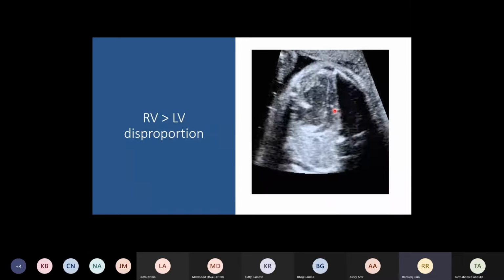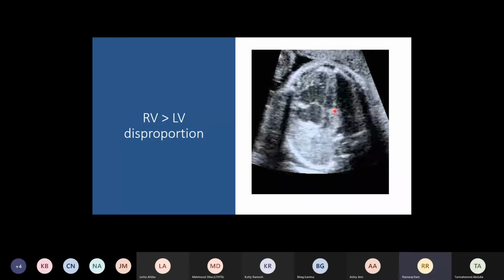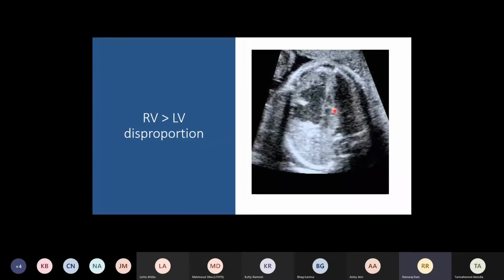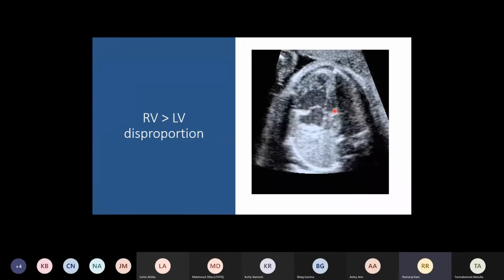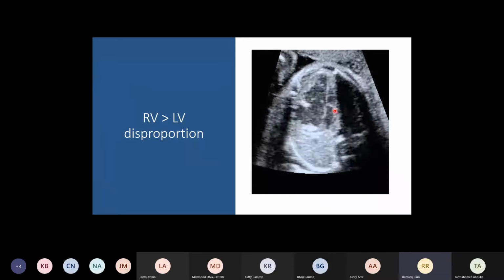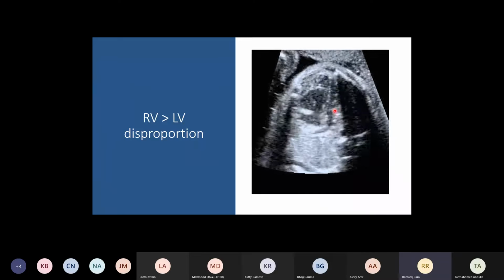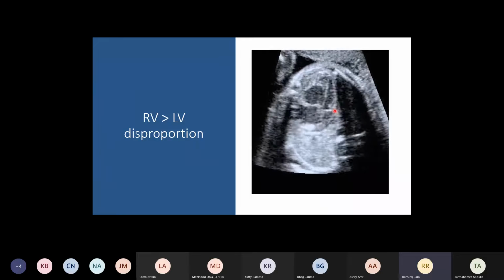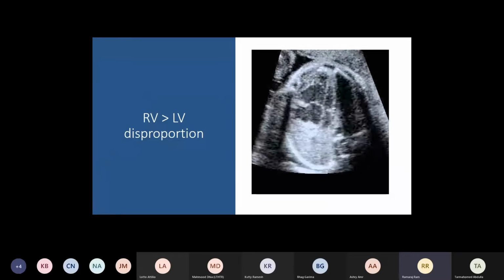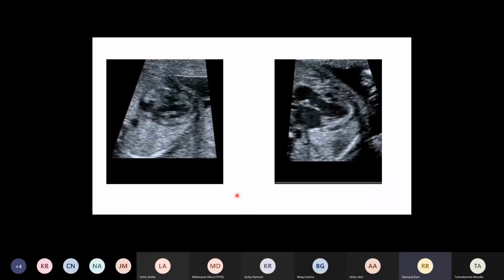So at an earlier gestation, a presentation like this is difficult to reassure. So you've got to be open with the family in terms of this may turn into a hypoplastic LV or a borderline LV, or this could be just an arch problem, which may be fully correctable and lead you into biventricular circulation. Later in gestation, if you see these findings not there in the first or second trimester, but in the third trimester you just see this, then it could be an associated normal finding as well, where you see postnatally things get corrected on their own.